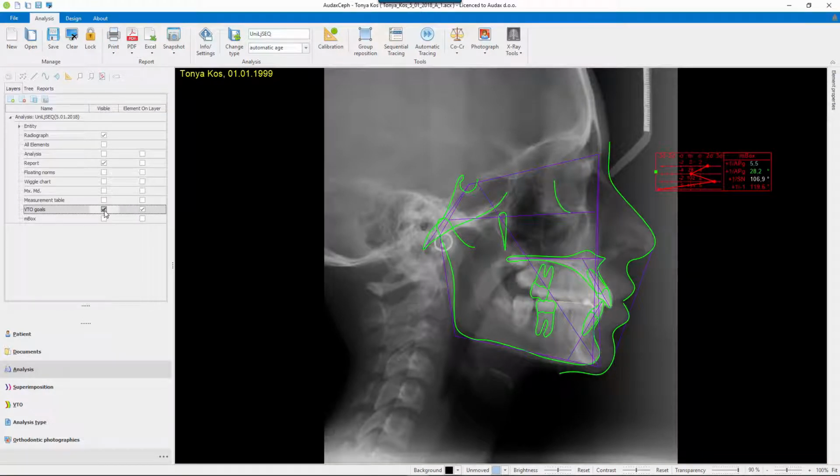This is something that I want to achieve, and when I study this, I can change that during the VTO itself, and I created a special measurement box which can be used for achieving VTO goals. So we will use those layers later in VTO.